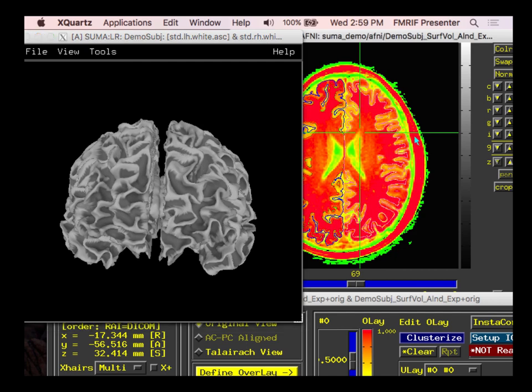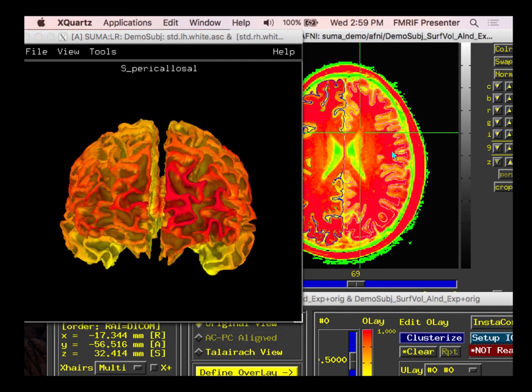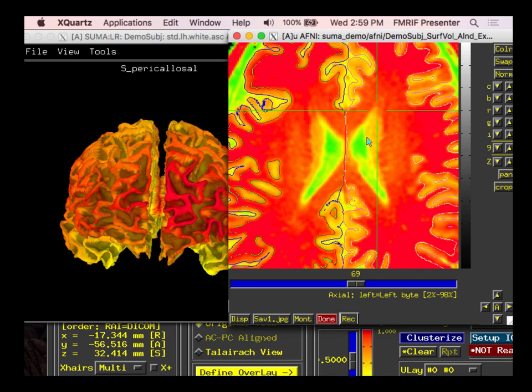they're programmed together. And what that means is they can send information back and forth. So I can represent information on one and send it to the other one. And so if you see here, these are the outlines. So this is the surface, and this is where it would appear in the volume space. So these things both occupy the same space, but they're different representations. And so this is what I'm projecting the surface into here, and let's say I can zoom in a little bit here. So you can see this is where it is.